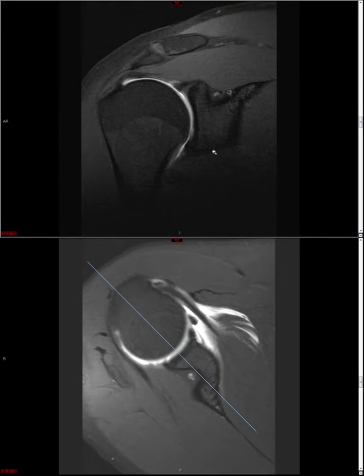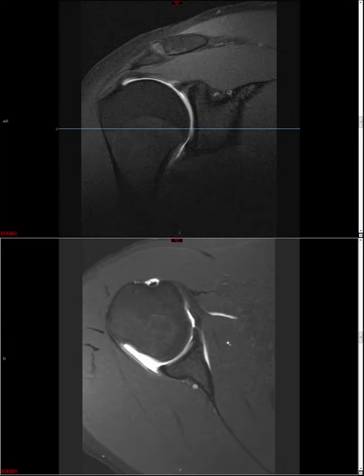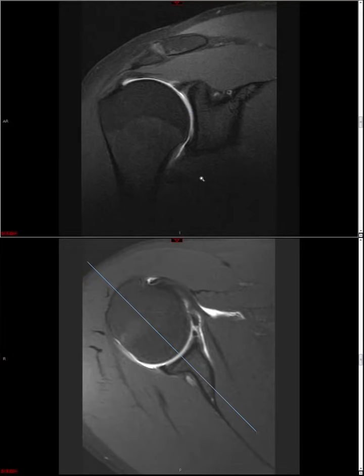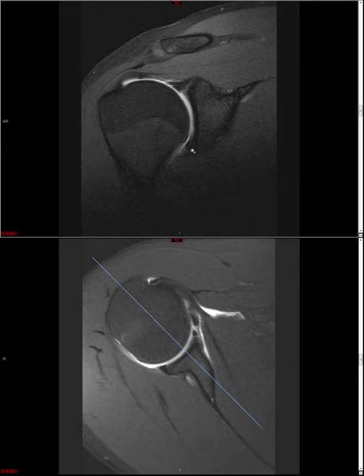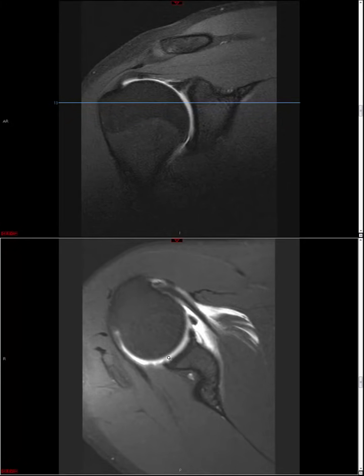And let's start with the joint first. So the joint you can pretty much assess just like you assess any joint, like the knee. Okay, so once again, the articular cartilage is for the most part going to have this nice intermediate signal. Remember that the deeper cartilage is going to be almost black, and remember that not all of this black is subchondral bone plate. Some of this is actually cartilage. Remember how we talked about if we saw signal heterogeneity, which admittedly is very subjective, then we would call mild chondrosis or grade 1 chondrosis for those who like to number their chondrosis.